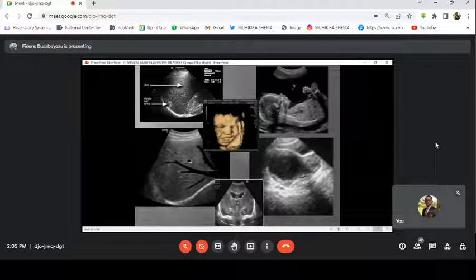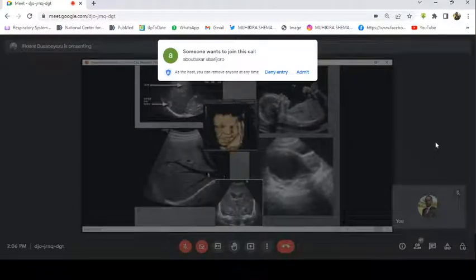Yeah. So going to this one, this is also the liver, but within this image, can you see my cursor, my pointer? Can you? Yes. From this image now, even this is the liver. You can see the liver parenchyma here, but also you can see these tubular structures that are black. They are black because, who can tell me the reason why they are black?